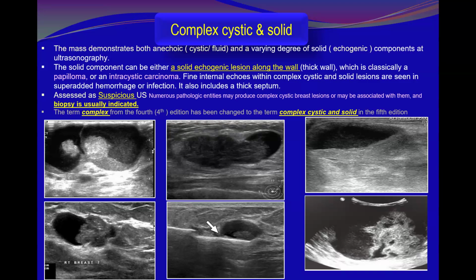In the 5th edition, they changed it to a complex cystic and solid mass, composed of or containing anechoic fluid with echogenic solid components.